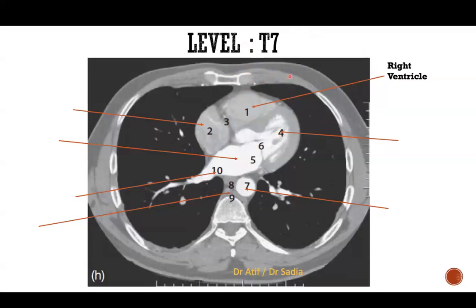Okay. Now, the right ventricle, what opens into the right ventricle? Obviously, the right atrium. Okay. The right atrium. What's this number three? What's the valve between the right atrium and the right ventricle? The tricuspid valve. Okay. And this is the left ventricle.